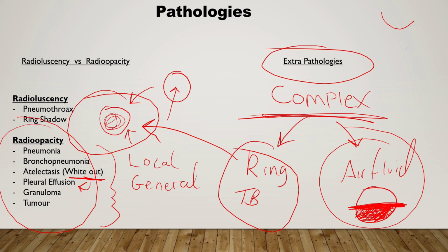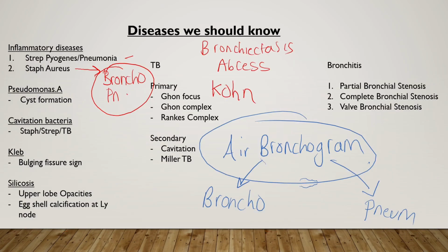If there is air, a hydropneumothorax, you'll see this horizontal depression. So don't get it twisted, brother. All right, don't get it twisted. But if you do see an air fluid shadow, this lesion within the lungs, maybe from a partially evacuated abscess, which we'll see later, which is caused by Pseudomonas aeruginosa, then you can conclude it's an air fluid shadow. All right, let's move on.